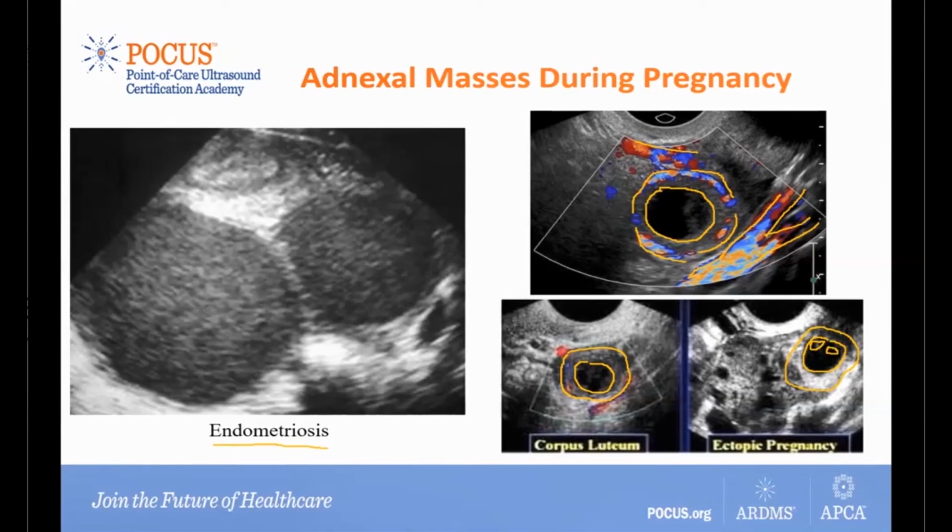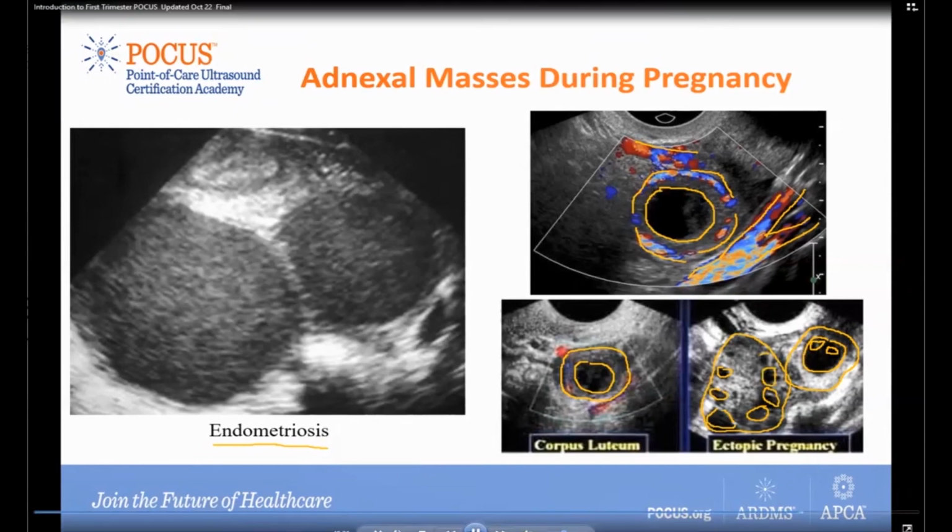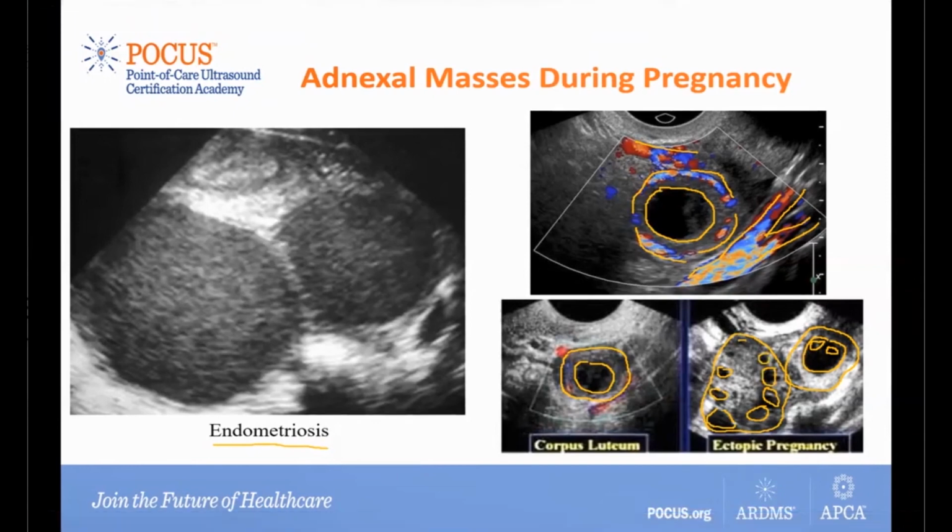This is ectopic. So this structure over here is the ovary, and inside the ovary we can actually see these immature follicles. So keep in mind that we're not going to confuse this with an adnexal mass. This is a normal structure. This is the ovary. I've just drawn a bunch of those immature follicles in it.